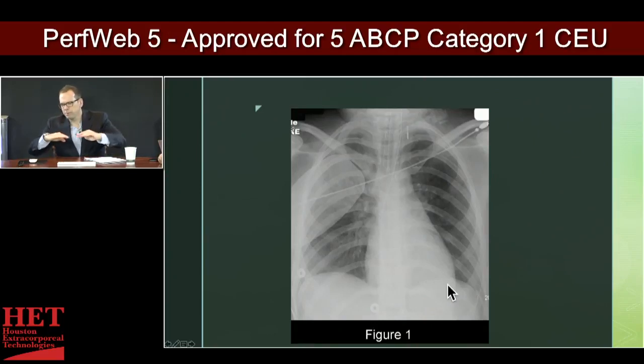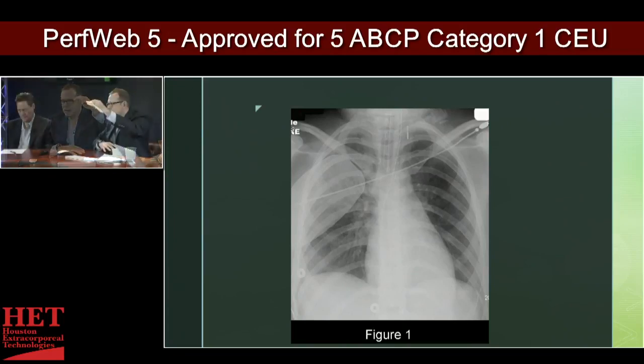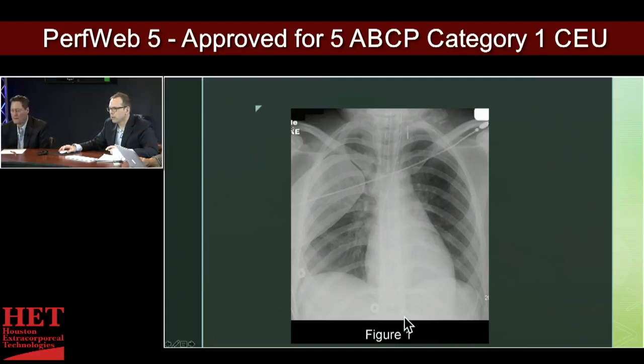Oftentimes you can see the diaphragms flatten in somebody with COPD or emphysema, and that will stretch that mediastinum, and therefore the cardiac silhouette's going to be elongated rather than kind of boot shaped like you would see in somebody with a CHF. So that's a good, healthy diaphragm, right? So yes, this is a good healthy diaphragm.